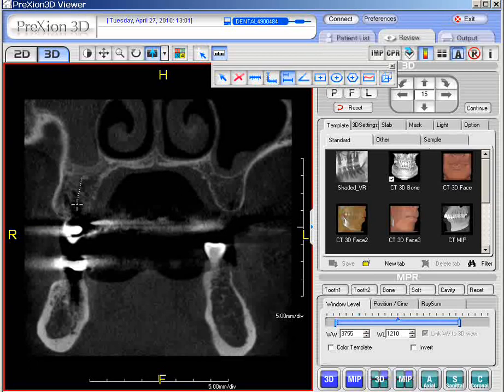So here we'll start, go down to the ridge of the bone, and here's baseline 1. It's always going to be the first measurement, always baseline 1. Now if we go to the second measurement, we're just going to left click it, drag it down, and release it to the edge. So what we're saying is the left side is 83% of what the right side is. So that's basically how you use that feature if you prefer to use it at all.